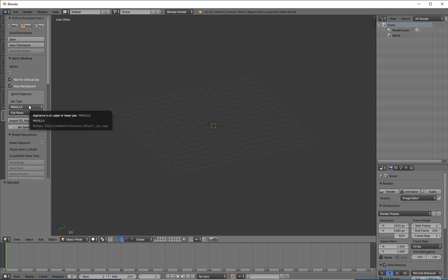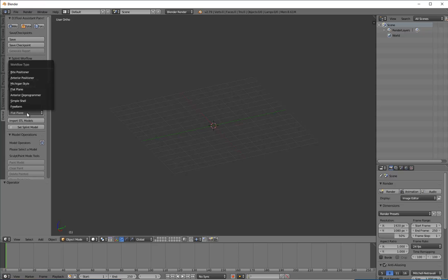Now we're ready to pick which type of appliance we want to make. In the following videos, we'll talk about what types of designs there are. Just as an overview, I can pick mandible or maxilla, and then I can pick the type of appliance. So I guess that's probably it for this video. I feel like there's probably something I'm forgetting, but I think that pretty much covers it all.